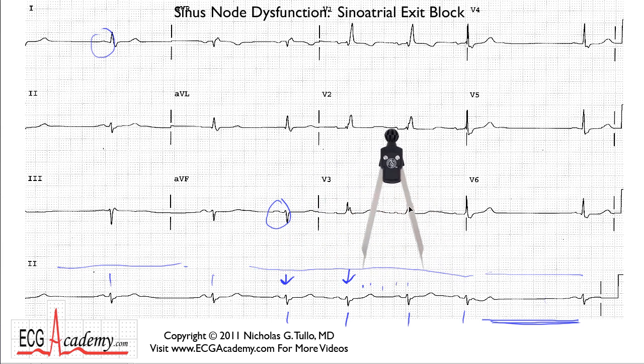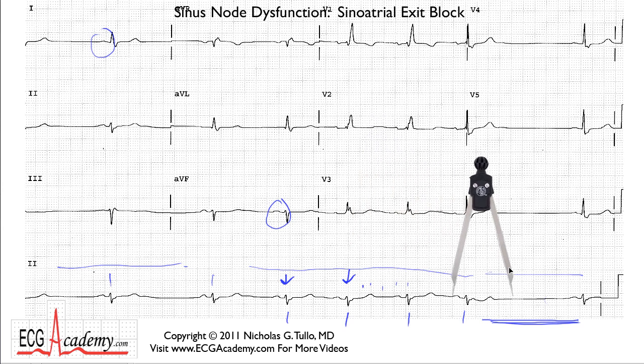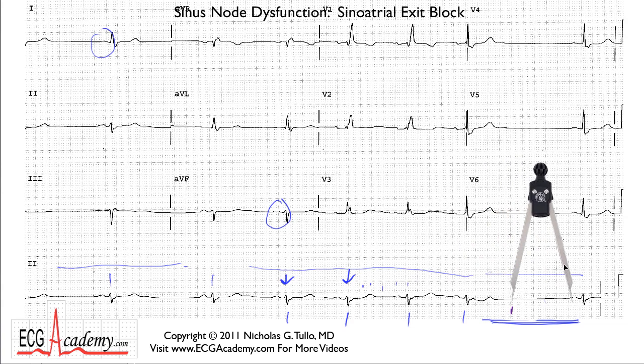And as I said, if you pick up the calipers and put it on a heavy line, you can count off a little bit less than 60 beats per minute. But the important part is when you put your caliper on this P wave here and you look to see what happened, there is no P wave in this segment of the ECG. It's gone. A P wave did not get generated. But the cool part is that if you make a mark over here and then pick up your calipers and bring it on over, you'll see that the next P wave pretty much occurs right on time. So even though there was no P wave here, the next P wave occurs on time.